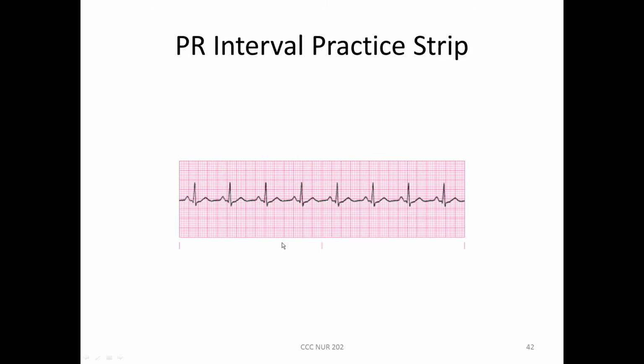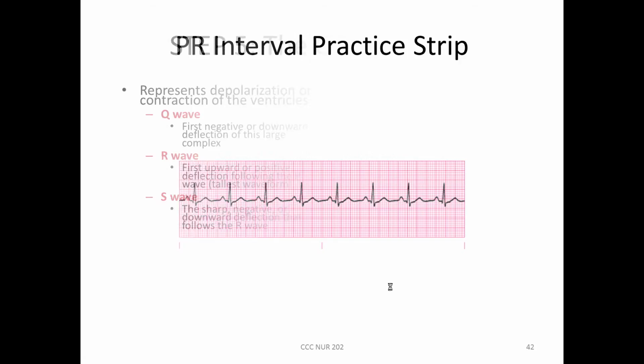So here's PR intervals. There's one there. So, can you see that the PR intervals measure within normal limits?